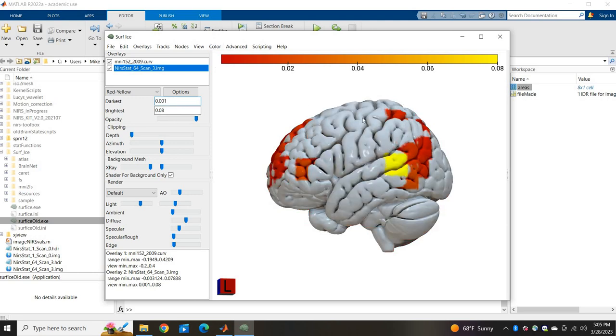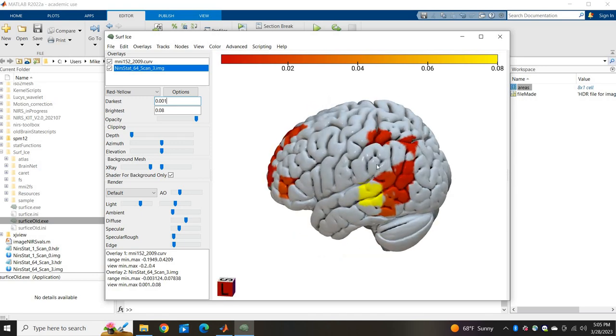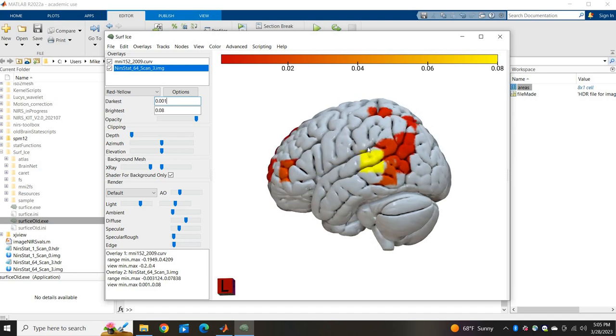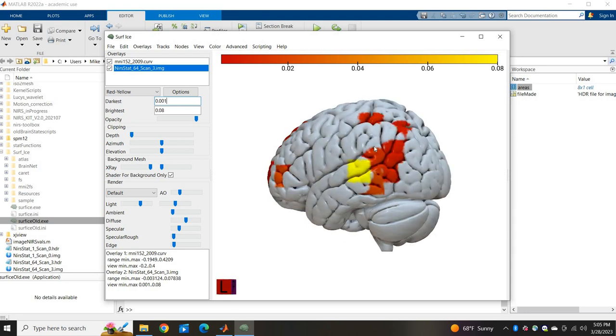Once I specify that, it actually gets rid of all the stuff that is not pertinent or that we didn't even measure. So now these are just actual real areas that are measured and have correlations. Like that TPJ area, just on average for the entire group, it has the highest synchrony. That's actually not surprising. And everything else is kind of low.